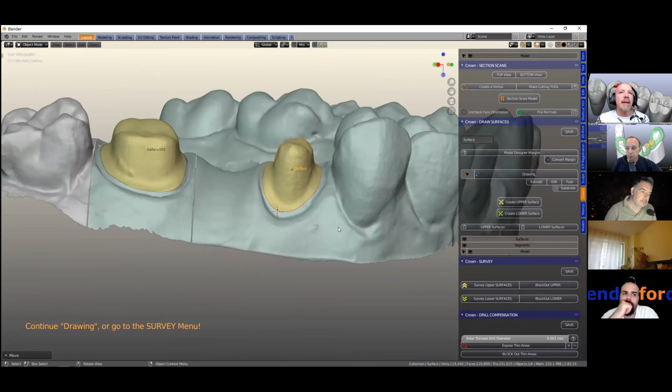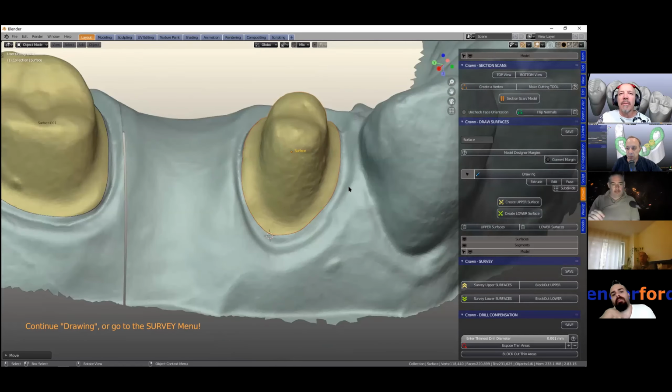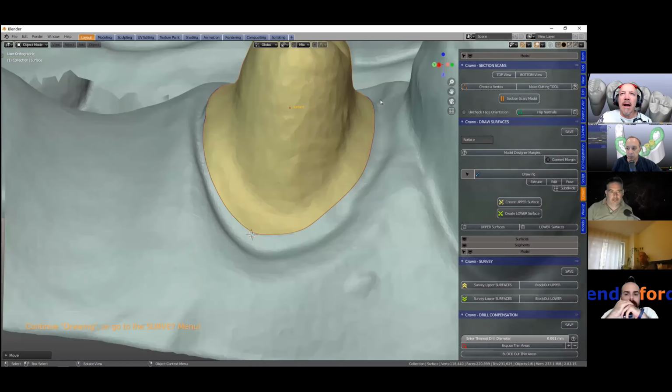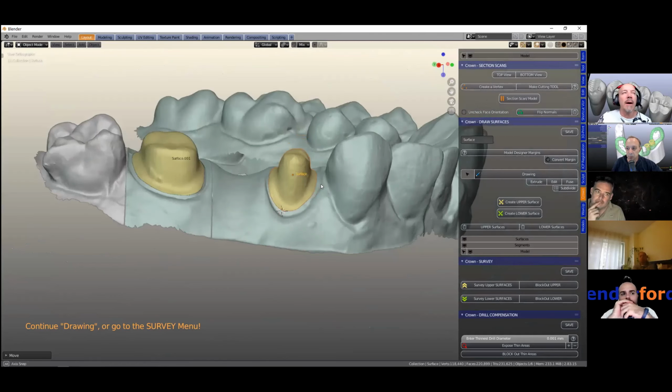There's also another thing: later on, when we're generating the crown or making a margin, for example, putting a little margin on the abutment, it shrink wraps towards the die section. So it does help in the procedure along the way.